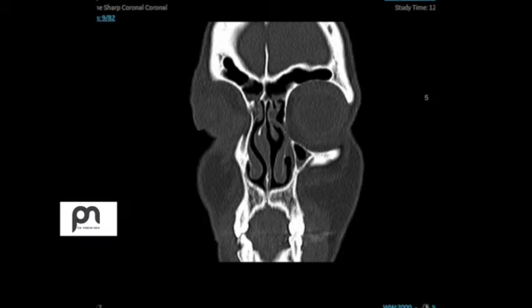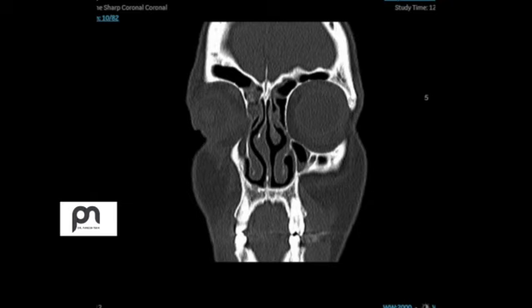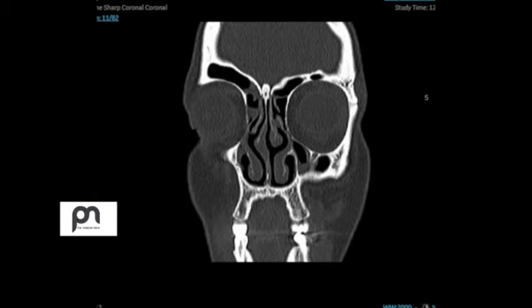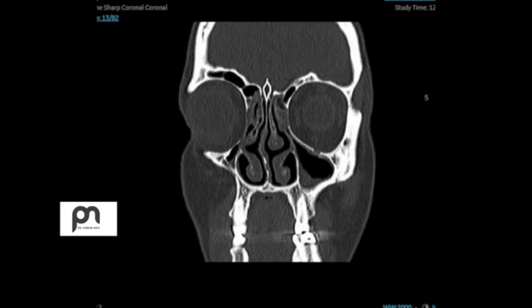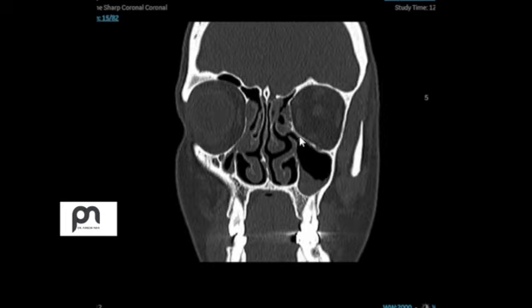So that's one finding. Now, I'm just going to focus on this important thing. We did mention that as the person is slightly twisted, there is asymmetry. However, I want to bring you to this level of scan. Can you see the right maxillary sinus compared with the left? Don't you think this sinus looks like a pediatric sinus, although this is an adult scan?